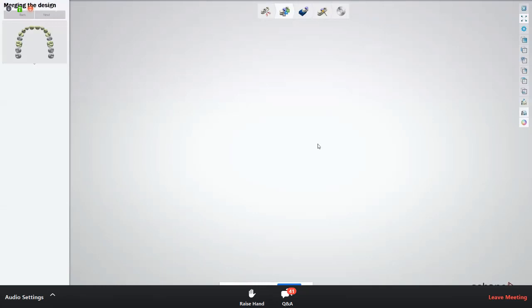And so now the final model is going to have every second tooth. And I mean, you can just imagine for yourself what you can use this for. You can add one crown, for instance, on the model. The other one can just be a die.